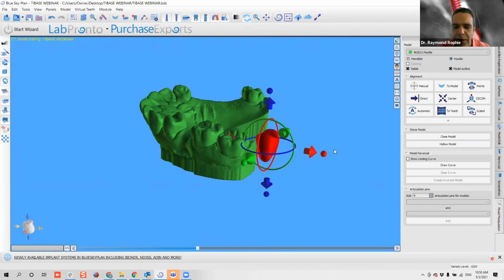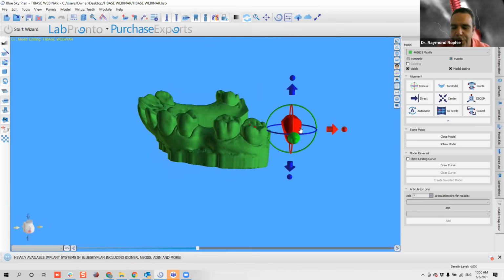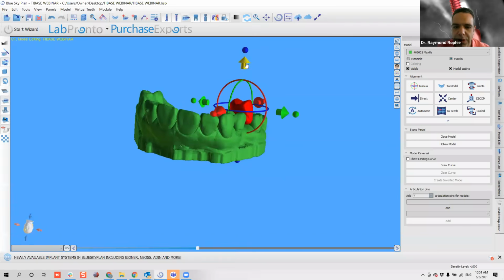It's very important that in order for you to move the object, you use the perspective where you want to rotate it, and then rotate it, and this will give you control on the movement, okay? Also, you have the arrows where you can move along the axis, and you have as well the nodes where you can scale the object and change the size or the proportions of the object.